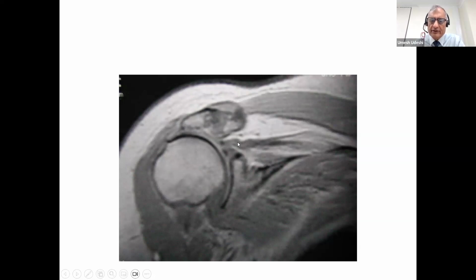And the volume should be a nice bulging biconvex shape. It's not, it's a shriveled little thing sitting here. This is the tendon. You can see it's rather wavy because it's been retracted and it's sitting there all loose and lax. Instead of being attached to the greater tuberosity all the way over here, it's been pulled back by probably around 3 centimeters or more.